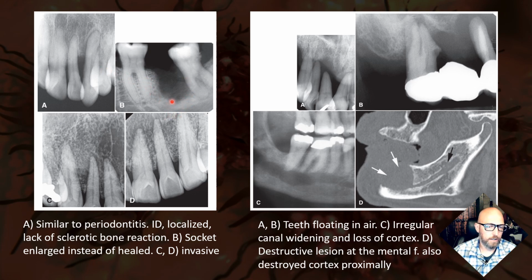This one really doesn't look like a typical acute periodontal lesion. It's just too destructive and round to be something like that. And so, yeah, they can be difficult to distinguish from just a periodontitis, an acute localized periodontitis, but do have it on your radar, especially when you see something this destructive and something that lacks those smooth sclerotic borders.